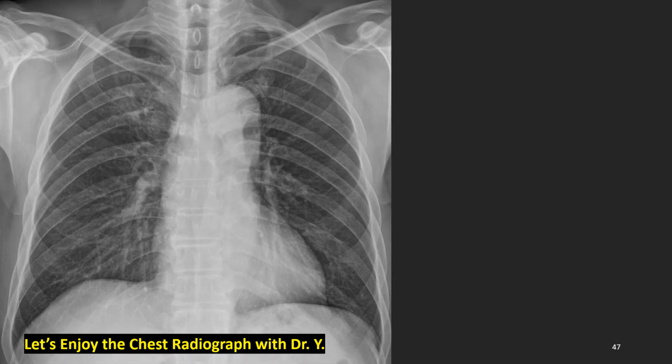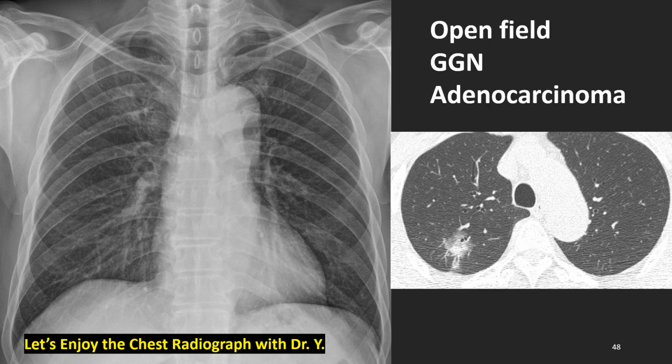How about this one? Yes. First rib, second rib. In between, there is some increased density here. No increased density here. Okay? So this is wrong. Something wrong. Yes, we found ground glass nodule of adenocarcinoma in that area, right upper lobe.